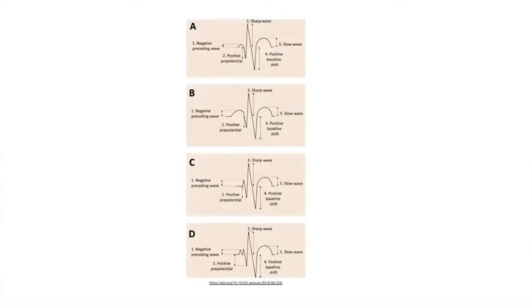The shape you see in front of you here probably looks a lot like the ECG or the EKG, and it's true, it is. And this is the fundamental shape for a membrane discharge. You have a depolarization and a repolarization. And that's what we see sometimes on the EEG, but in particular, during times that there is a coalescing or synchronization of activity.